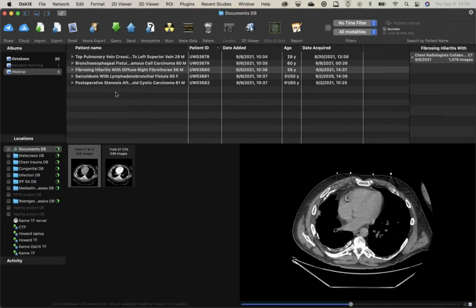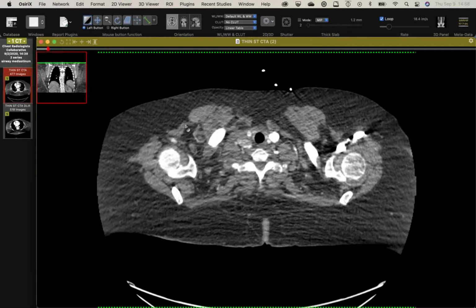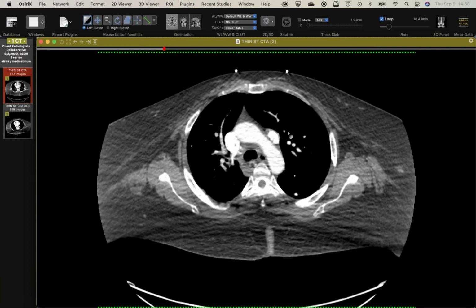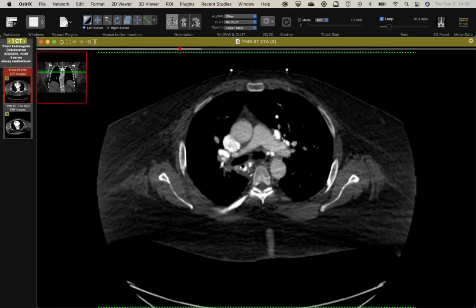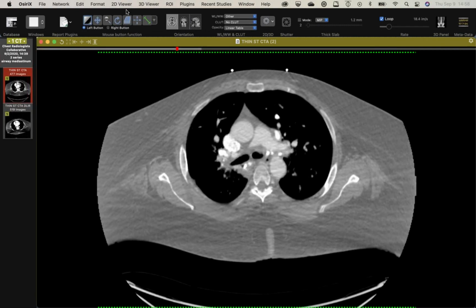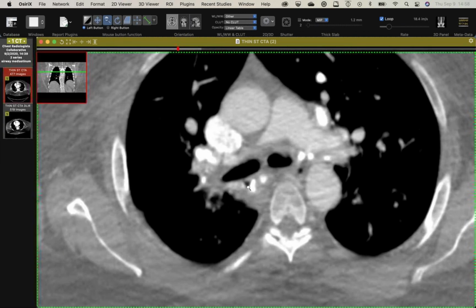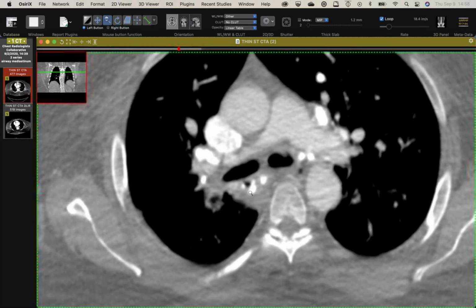Right. All right, let's see which one. I have time for one more real quickly. This is just kind of an interesting case. This is a patient who has a known diagnosis of sarcoid. There's no question about that. You've got these nice calcified lymph nodes with a mix of dense and sort of putty or icing sugar. And on the last scan, it was observed that there is a little communication, either a diverticulum or a fistula, between the bronchus and the lymph node.